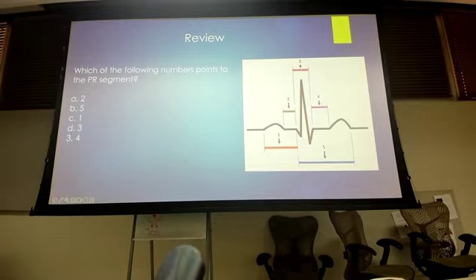All right. Carboneer? How do you say that? Carboneer. Okay, Miss Carboneer. All right, let's look at the first heart.